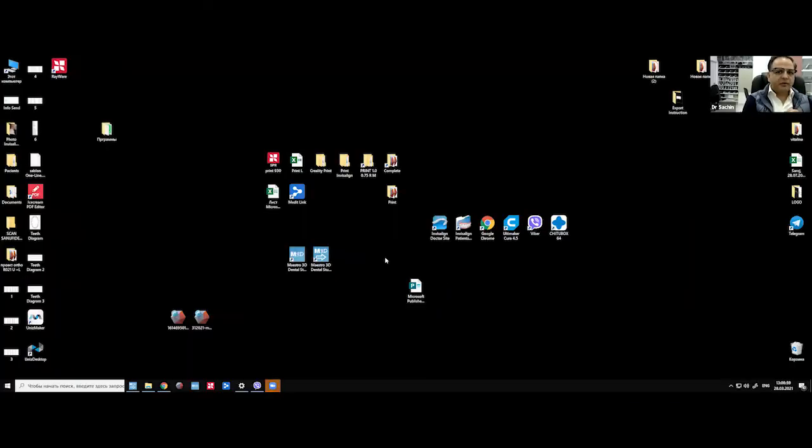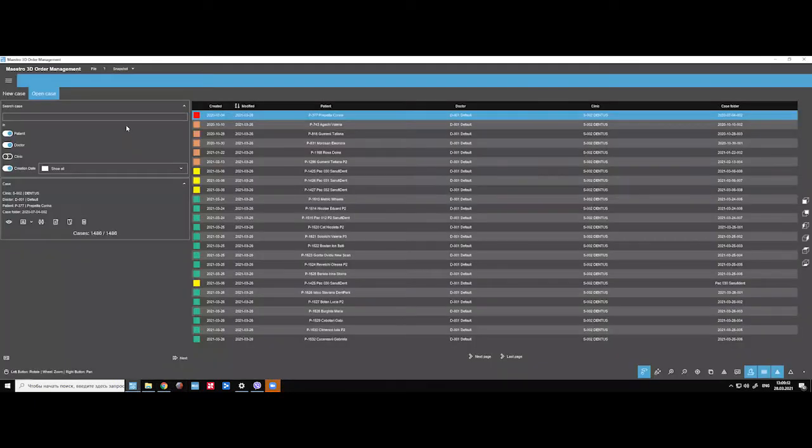Can you see my screen now? Matthias, can you see my screen now? Yep. It's perfect, Sachin. Okay. Everything's fine. Perfect. So we'll do import. My friend Alexander will come on the screen now. He's going to do an import of a simple case, do the segmentation, and then we'll talk about the attachments on that case, right?